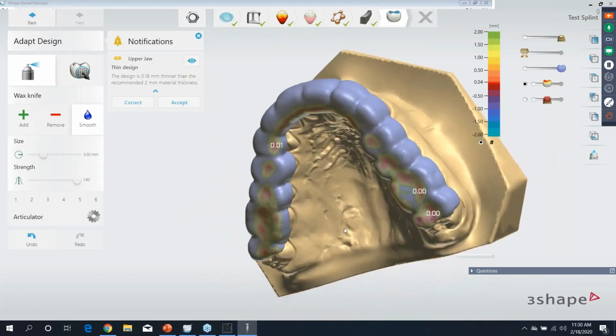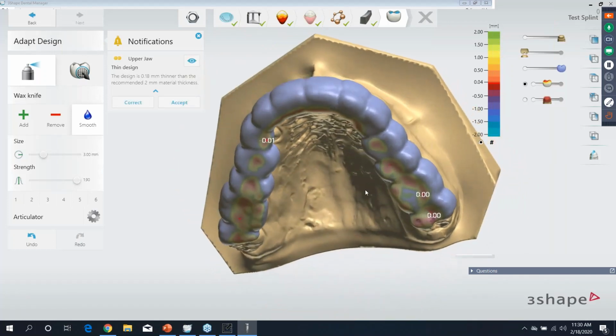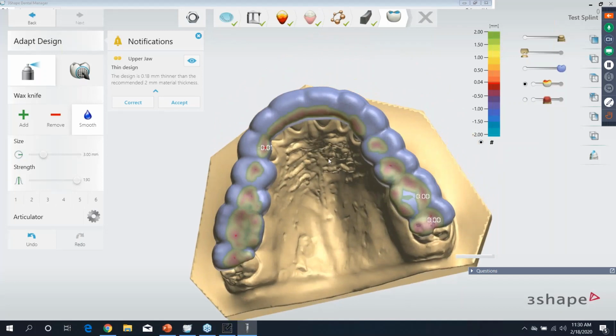If you're scanning it in with your desktop scanner, add another few minutes on there for your scan time, and that's it. You can really have these designed and exported, ready for manufacturing, and realistically, once you're proficient with the software, anywhere between 5 and 10, 12, 13 minutes. It's very, very quick.